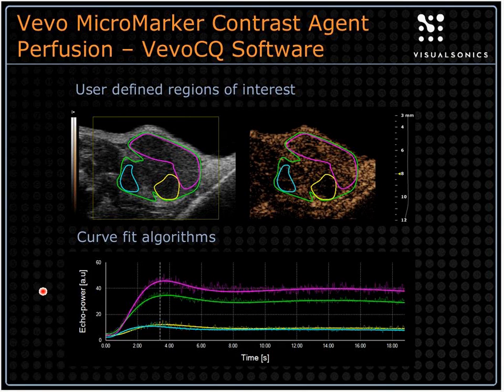And then in some cases, if it's too short, you'll also see an exclamation point and a value of NA, and that's because either the clip was too short or the area was too slowly perfused for the tissues to actually get up to a full level of circulating signal for it to be able to apply those models to. So playing around with the frame buffer, playing around with the size of the image and things like that will allow you to stretch that time out and hopefully give you enough time to capture all of the data that you need for the signal to get where the software wants it to be.